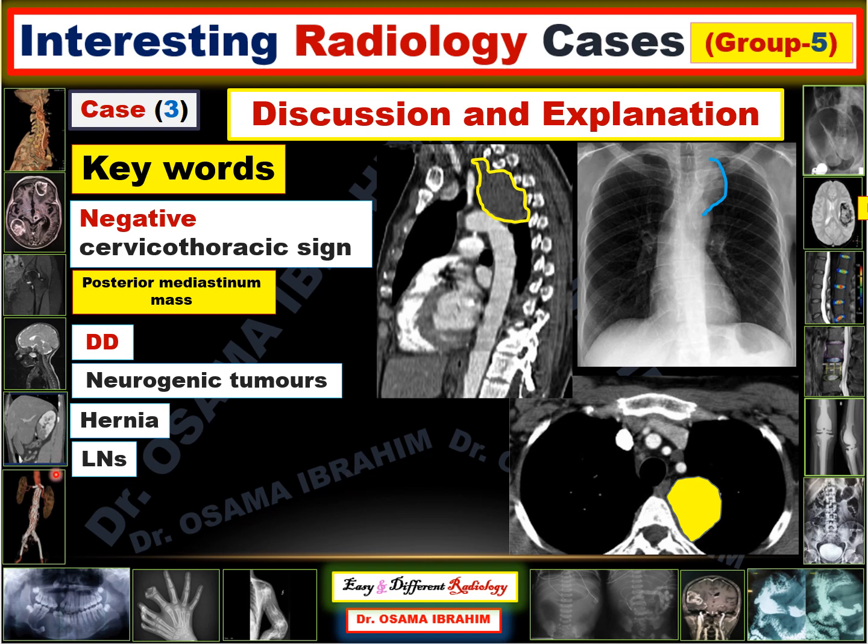Lymph node enlargement due to any cause can be considered a cause for a posterior mediastinal mass. However, it occurs in the anterior mediastinum more commonly than the posterior mediastinum. Lymph node enlargement can be due to metastasis, inflammatory processes, infections like TB, sarcoidosis, or like this.